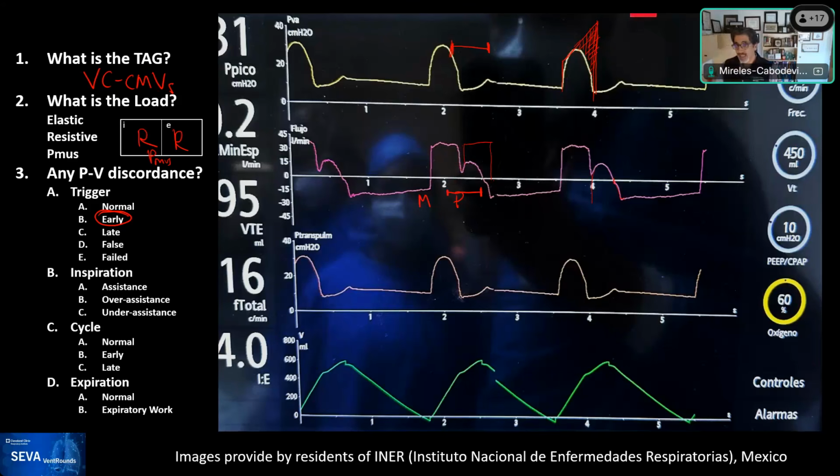And so seeing this large double breath, they said this is not a good thing. They changed the trigger to a threshold that would not allow you to trigger the next breath, essentially locking the patient out of getting the second breath. The patient is getting some flow and some support from the PEEP, but essentially the patient took a breath and then continued to take a breath afterwards, and we canceled the ability to double trigger by changing the threshold.